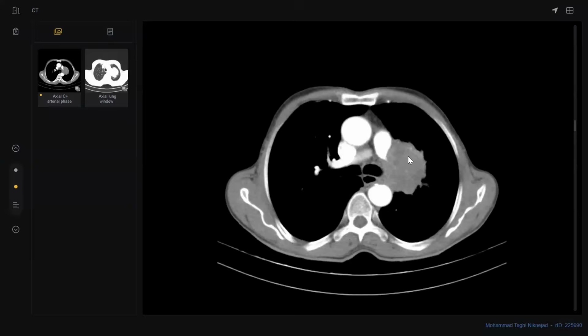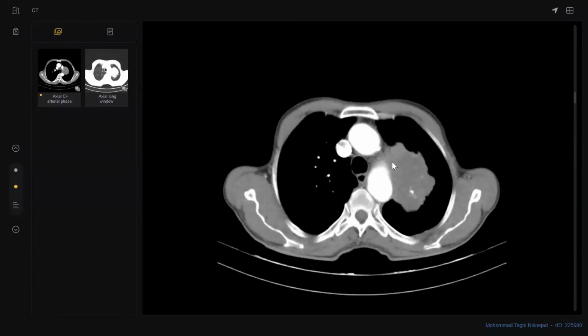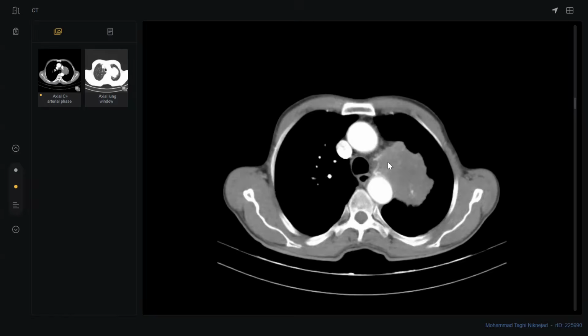As the patient has complete encasement of the left main pulmonary artery, interventional radiologists or vascular surgeons should be informed of these findings and further management. Okay. You may use a stent. Yes, it is very important to save this pulmonary artery.